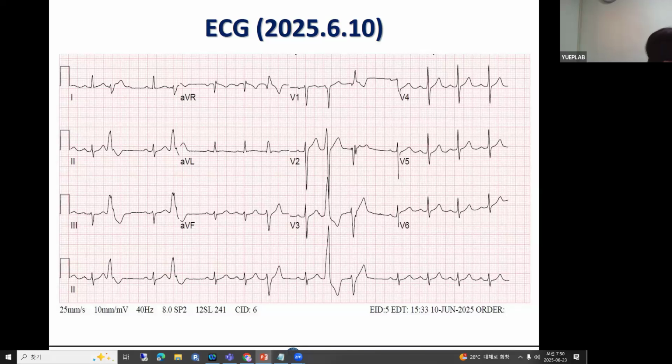And if you look at the wide QRS rhythm in the limb leads, on the left side, the 2, 3, aVF became shorter, and lead 1 shows a small Q wave and a delta wave. So probably this exit is much lower than the previous PVC one. So I guess it could be coming from the same focus to a different, lower exit. Yeah, left side.